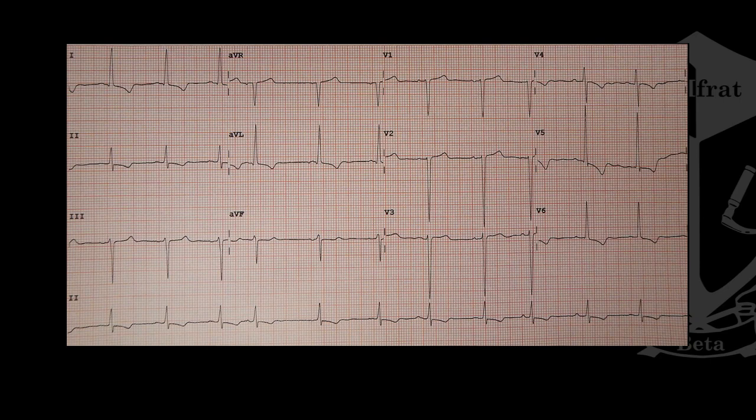This ECG vlog is going to be all about axis deviation. So the question posed, without any clinical information, what is the electrical axis of this 12 lead? And for those that answered leftward axis, congratulations, you got that one right. So this quick video, hopefully, is going to be about a rapid method to identify axis deviation. Hopefully you spend no more than 30 seconds looking at it.